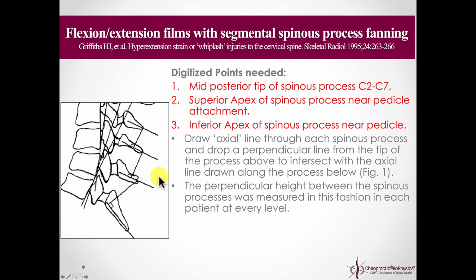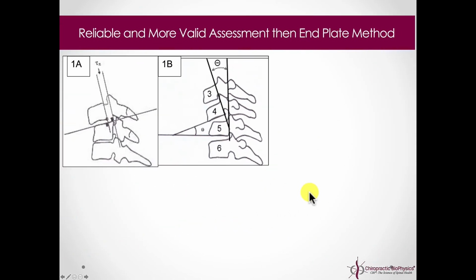So they also showed that you could measure perpendiculars and measure the distance if you did it this way. You can use PostureRay in the annotation mode. If you don't know how to do that, you can reach out to our support team and ask how to do this. Basically, in the drawing mode, if you're using DICOM images or any other calibrated image, you can measure the true linear distances here. And yet that's another method of instability analysis. So greater than 12 millimeters would represent a problem, obviously.